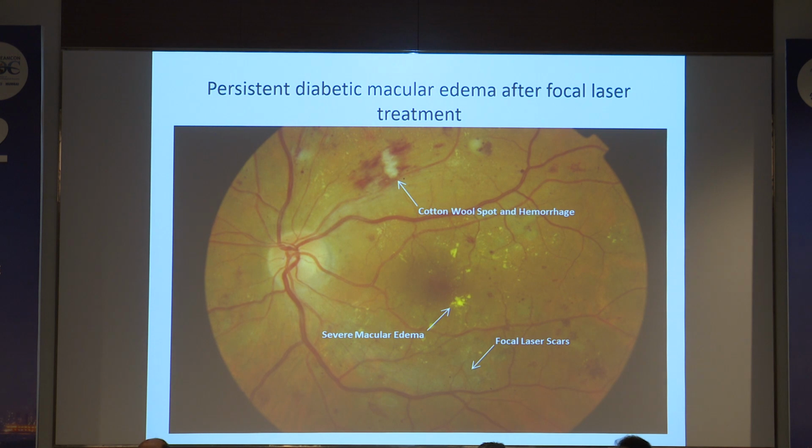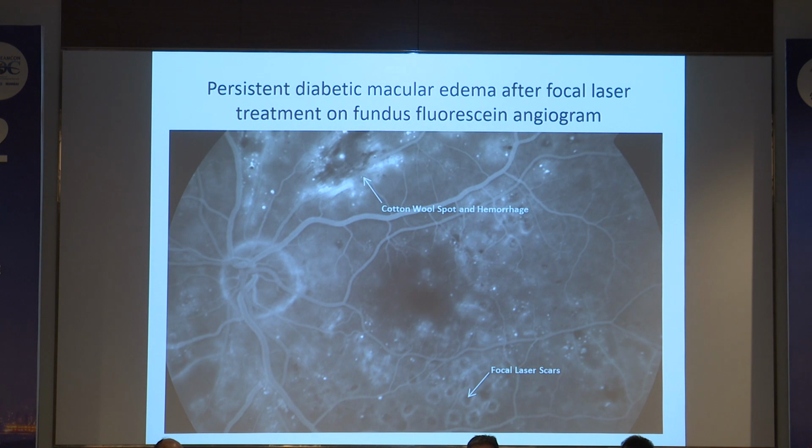This is another case, persistent diabetic macular edema. Now here what will you do? This is the last slide before we finish. This is FFA done. What will you do? The laser marks are there. Focal laser marks are there. What are these?